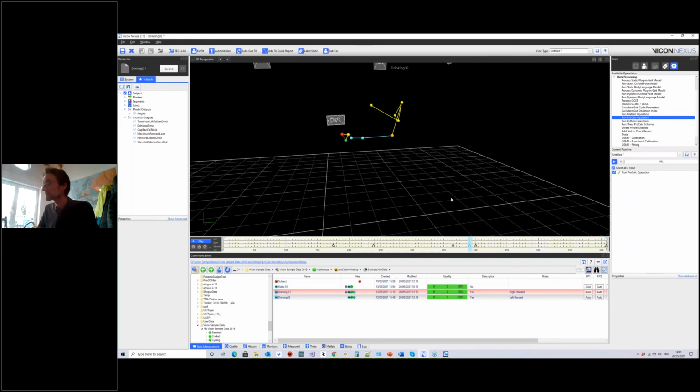We see that it has one extra event, so we actually need one more condition to avoid these false identifications. This is obviously one of the reasons you would do a pilot study for this kind of thing, to perfect the schemes.